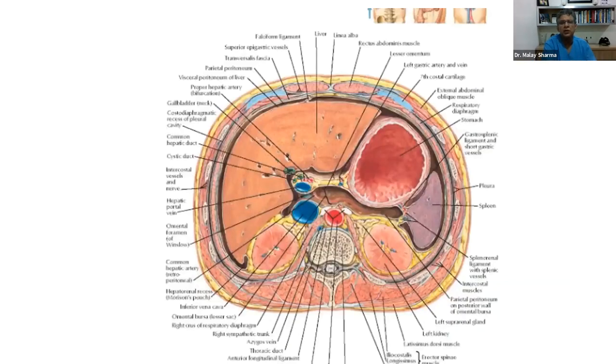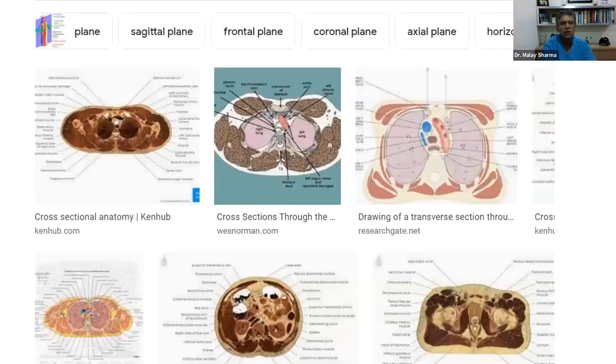And though this diagram is too elaborate, yes, you can imagine when you are in the stomach, you will be able to see this ligament, liver, left lobe of liver. You see in this direction, the beam goes there, you see IVC, aorta. Important thing is when you see IVC, you cannot see spleen from the stomach. What you can see is important. What you cannot see is equally important.